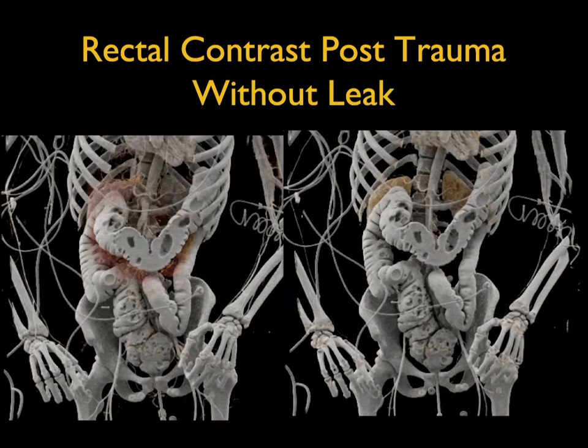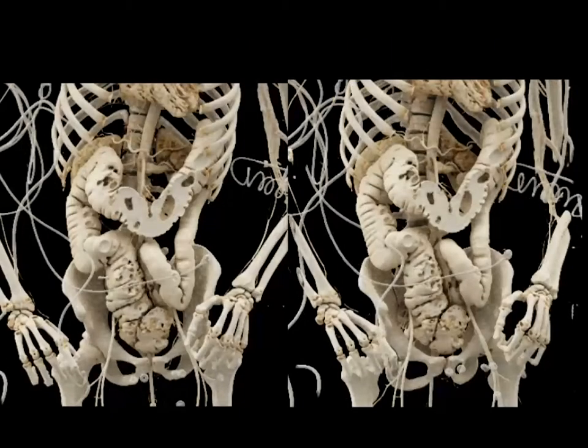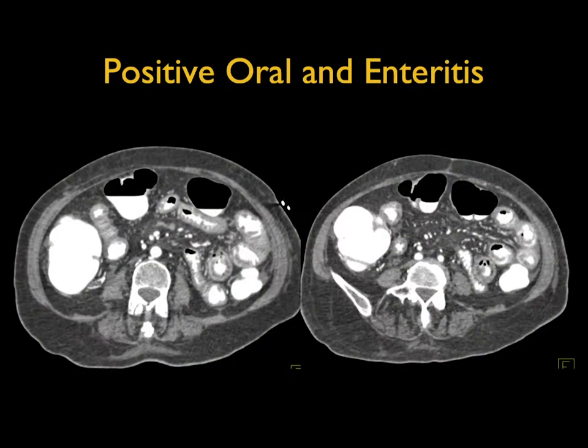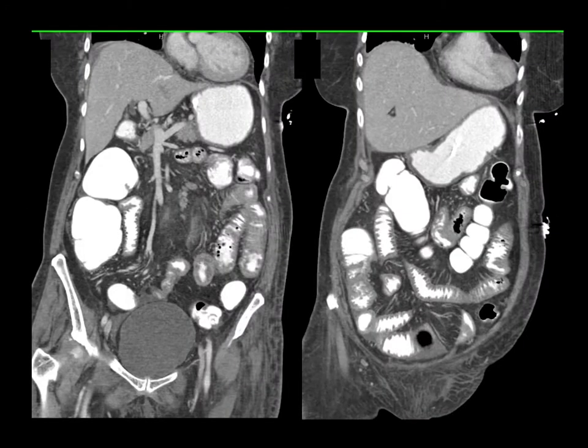And patients sometimes are given oral contrast, and this is a very nice example of a rectal contrast given to distend the colon post-trauma. There was no trauma to the rectum or any of the bowel, but look at the nice detail you can get with cinematic rendering showing you the colon, showing you the haustral fold pattern, not showing any leaks. Or in this case, this patient has really thickened small bowel, severe enteritis, really impressive disease.